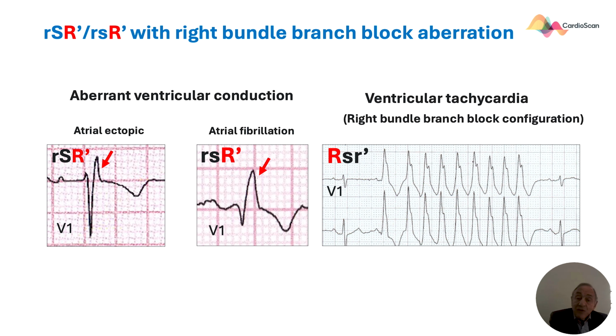Now, this is ventricular tachycardia with a right bundle branch block, but it is incorrect to use the term right bundle branch block because conduction is not via the normal conduction pattern from the AV node through to the left bundle, but rather this is an ectopic focus and therefore has a different wave of depolarization.